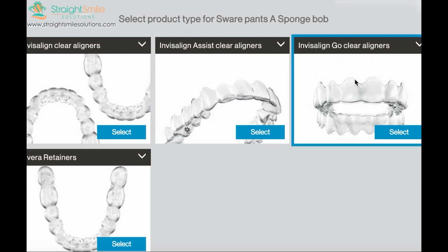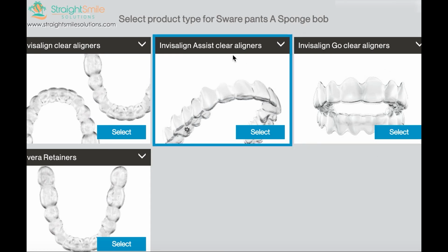In terms of your outcomes, it's way limited here. With these, it's just going to be anterior treatment. It makes it very clear, like you can do this. With IPR, they kind of help you a little bit and they give you a few clear options, but they're not going to move back teeth, fix bites, anything like that. Okay. With this one, same thing. They won't use a lot of the features. They will have somebody help you.